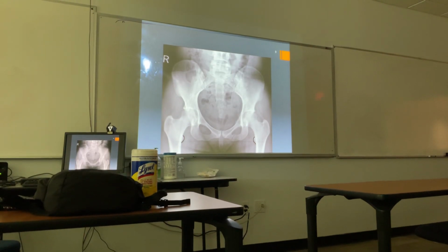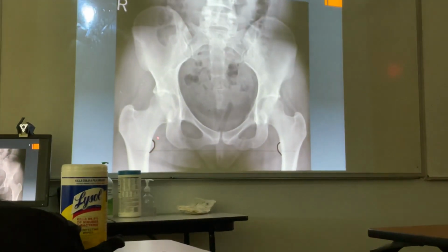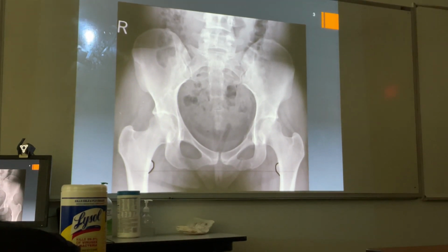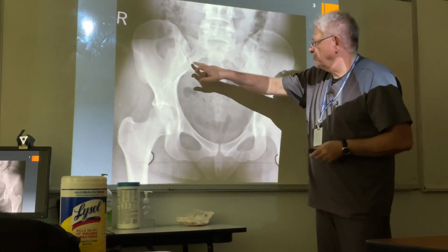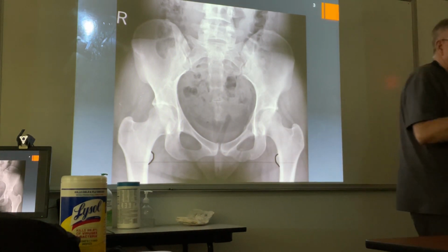And a lateral, if it's well done, because you can see the lesser trochanters, either on a combined pelvis view or on your segmental examination of the hip. Now, when you look at this exam, lumbosacral junction, SI joints, hip joints, and symphysis pubis need to be part of your search pattern.